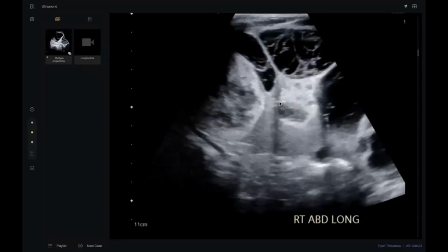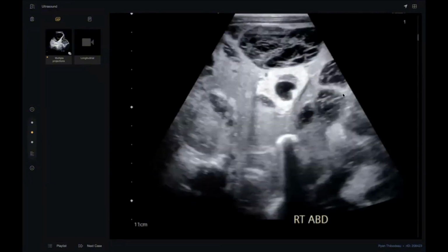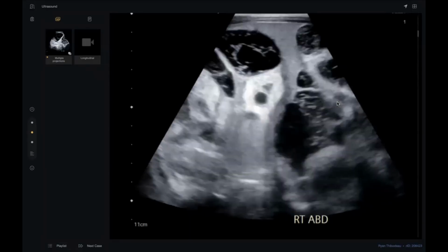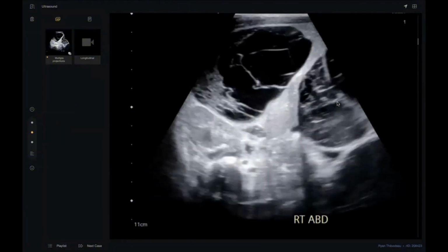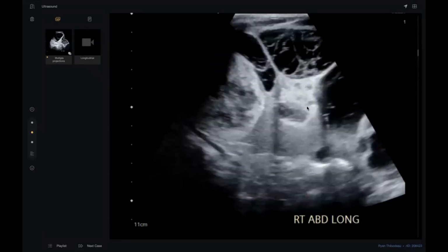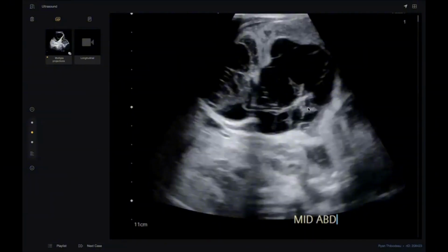After X-ray is ultrasound. See, doctor, take this one. This is scrollable. Okay, now this is scrolling. So first I will scroll. I think it's jumping mid-abdomen. Okay. These are grayscale images of the same patient. I can appreciate a large loculated cystic mass in the right upper abdomen and also extending into the mid-abdomen. I am looking for its relation with the liver.